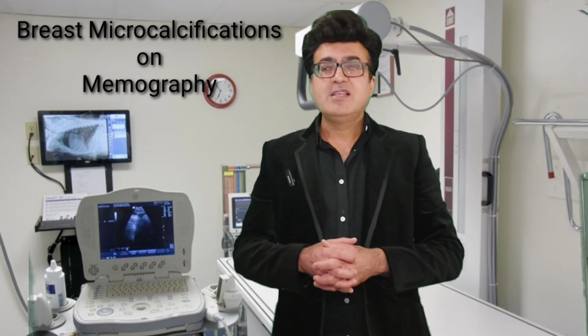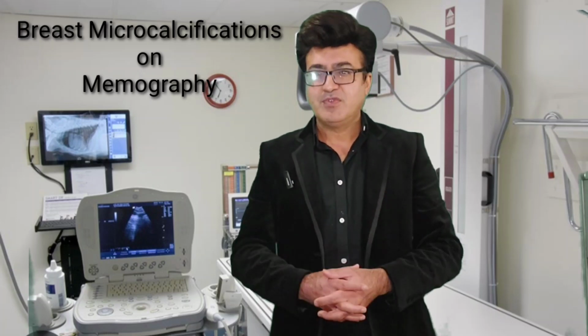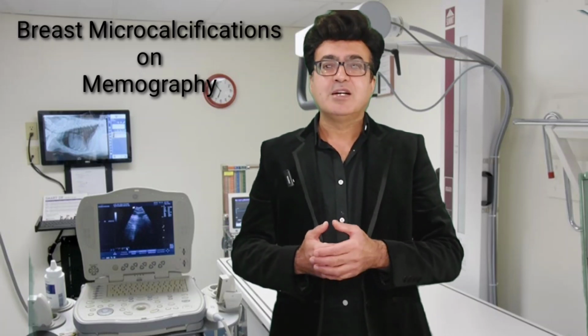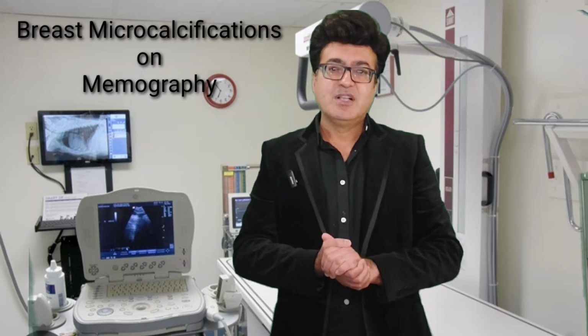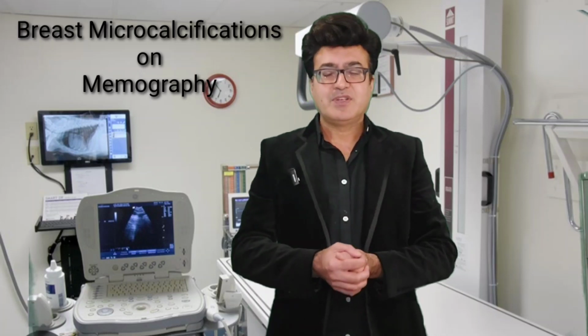For example, if there are any vascular abnormalities, it may give rise to a tramline calcification, which is benign. If there is any ductal ectasia, it will appear as a broken needle calcification. If there is fibroadenoma, it will appear as a popcorn calcification.